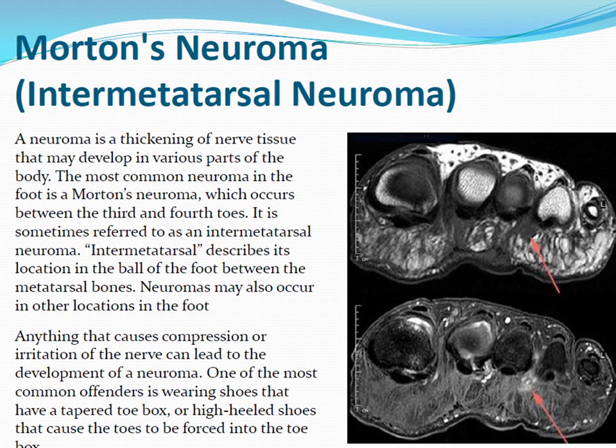So you want to make sure that you include the metatarsal heads and the bases of the toes pretty well. These develop from irritation of the nerve, and they're associated with having the metatarsals squished together in a tight shoe, or a shoe with a pointed toe that forces your toes to be too close together. So what you see is a low T1 signal area, high T2 signal area. Sometimes it'll be even really fluid signal, and that's basically all you need. Sometimes you'll even see it as a little barbell squeezing between the two metatarsal heads.